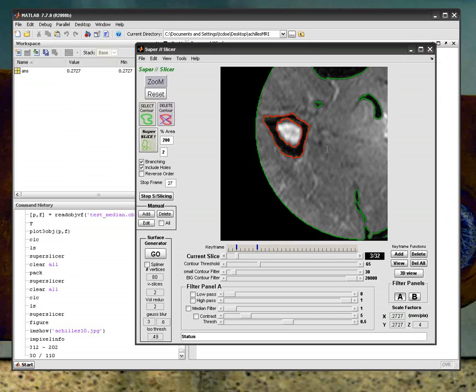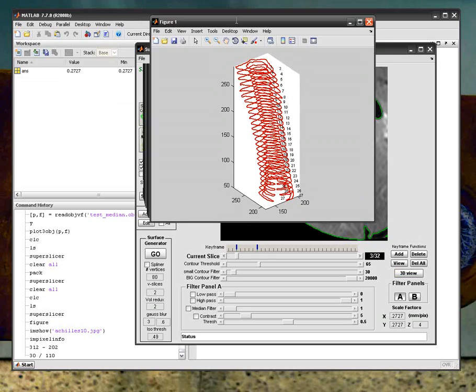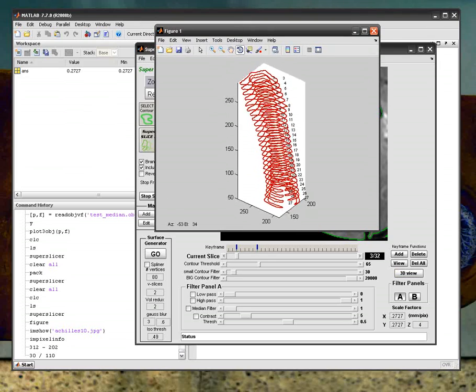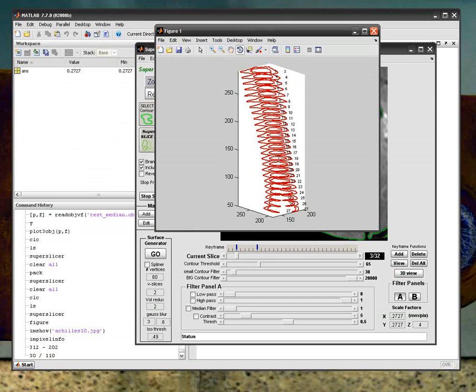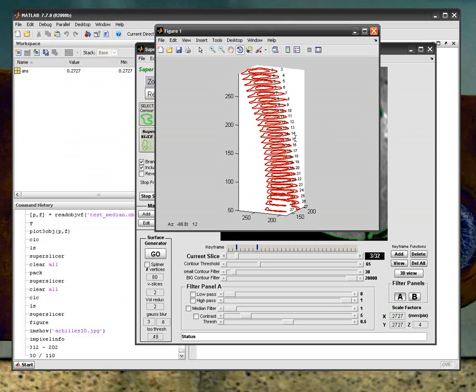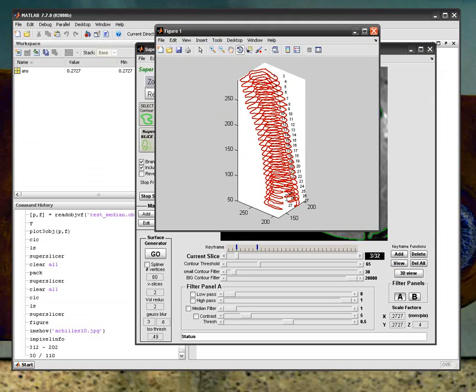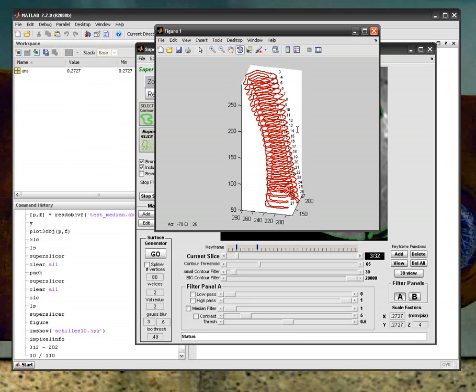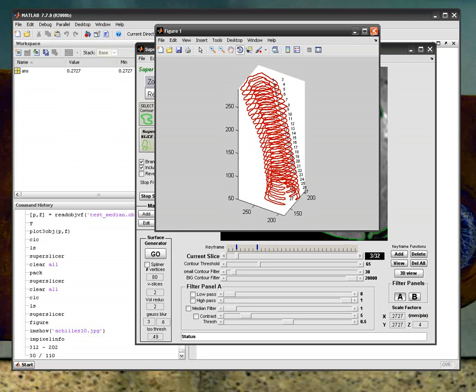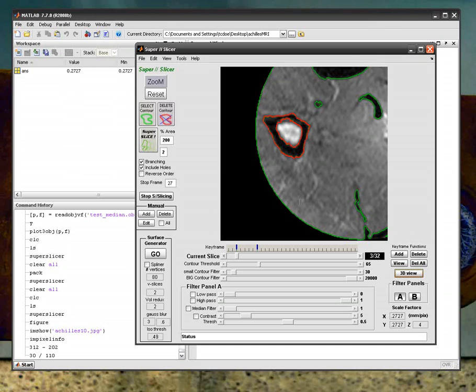Okay, that's it. We've sliced all the segments. Now we can take a quick look at the contours that we segmented. It looks reasonably good. All right. So we've been able to segment quite a long section of the fibula. And as you can see down towards slice 26 and 27, we're starting to lose fidelity. But for this demonstration, this is fine. We might have been able to tweak it to improve it a little bit, but you can experiment. So I'll close this window now.